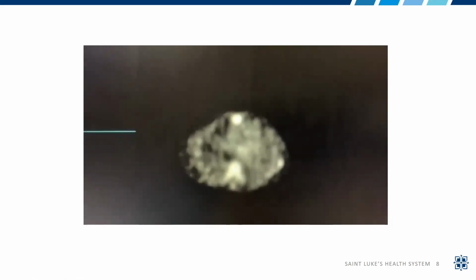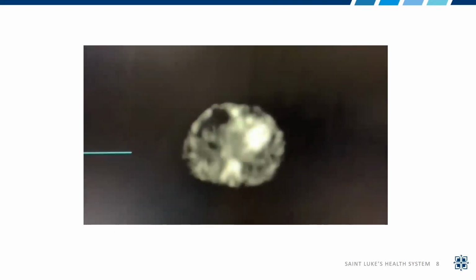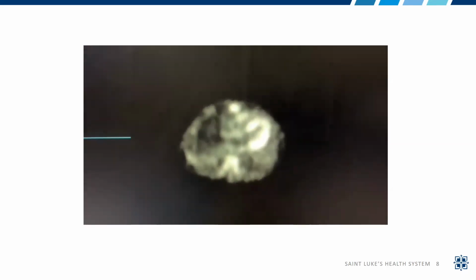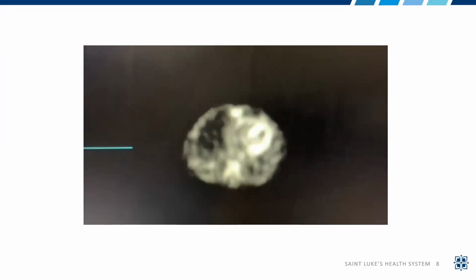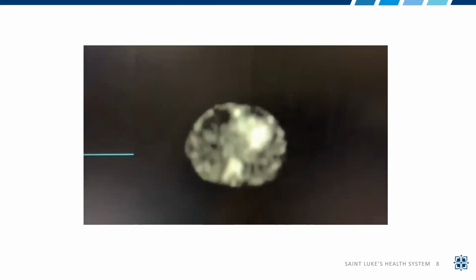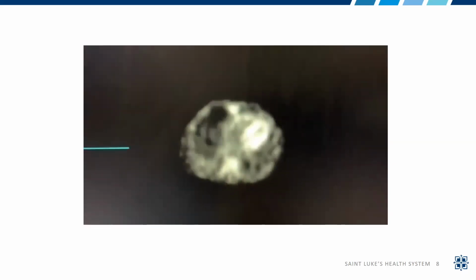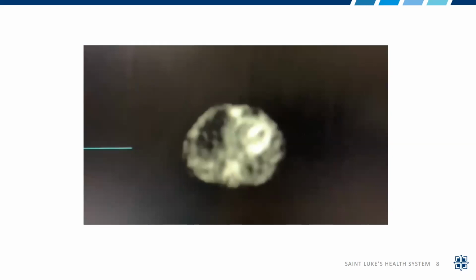Eric, do you want to add anything as far as looking at these images with respect to the planar and SPECT, and then really getting into the images and taking control? Yeah, from a technologist standpoint, this test is a pretty easy test because it requires little to no patient preparation. And any lab doing MPI SPECT imaging should be able to do both planar and SPECT imaging of the Tech PYP radiotracer.